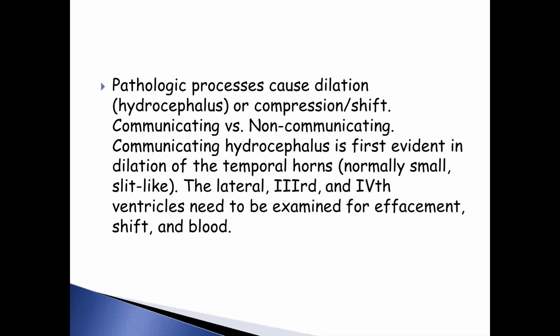Pathologic processes cause dilation or compression shift. Then there's communicating versus non-communicating. Communicating hydrocephalus is first evident in dilation of the temporal horns. Then the lateral, third, and fourth ventricles need to be examined for effacement, shift, and blood.